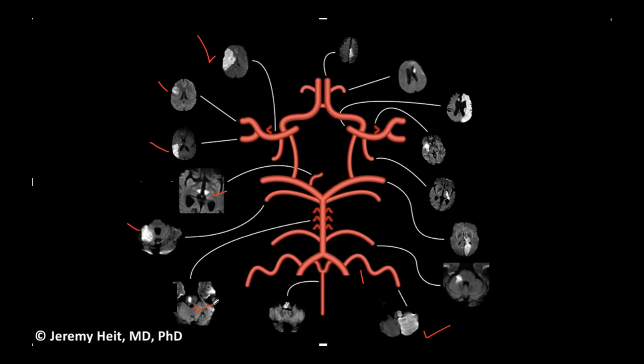This one is the easiest. Basilar. The basilar artery, but what is it? Everything is basilar. All these are basilar branches, right? This is specific. And the name is also based on the location. What is the geographic anatomical location there? Pontine perforators. So they are pontine perforators. Awesome. And which is this one? ICA. ICA. This one? ACA.